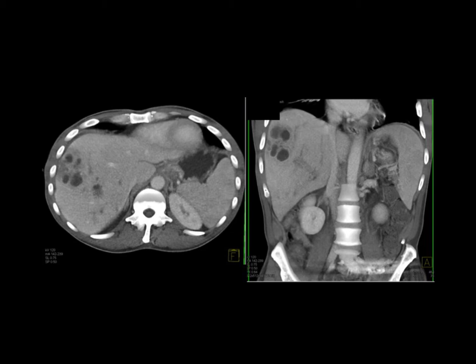Could it be an infarct? An infarct's one of the complications, injury to the hepatic artery, for example. But these tend to be rounder in this case than infarcts. And also with infarcts, usually you have the symptoms about 3 or 4 days post-surgery. It's not ascending cholangitis because you don't see any dilated ducts.